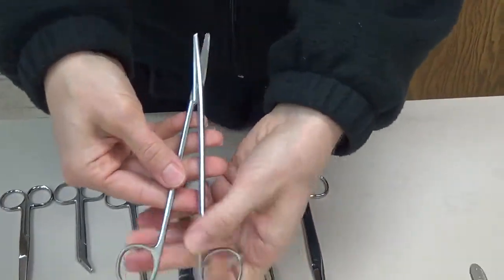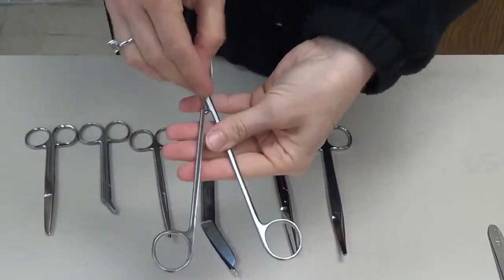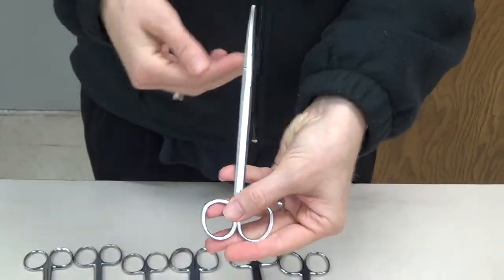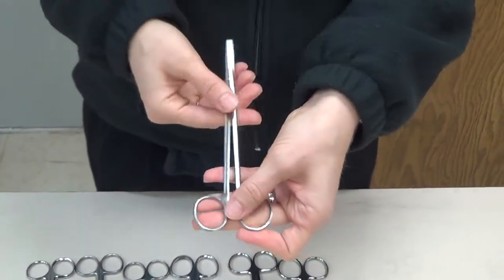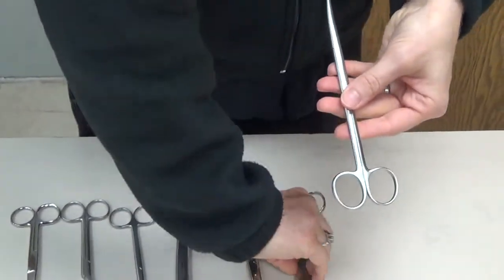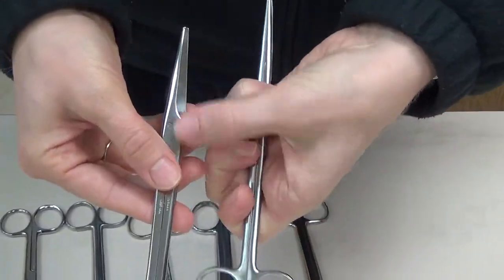So the Metz scissor, you can see, like we said before, has the very thin blades used for fine tissue. It does come in multiple lengths. This is the basic length. So this is what we would use for the initial dissection of going in through an abdomen. Deep inside the abdomen, we might use a longer length, just depending on the patient's size. Now, in comparison to the Metz, we have another very common scissor that we use, which is referred to as a Mayo scissor.